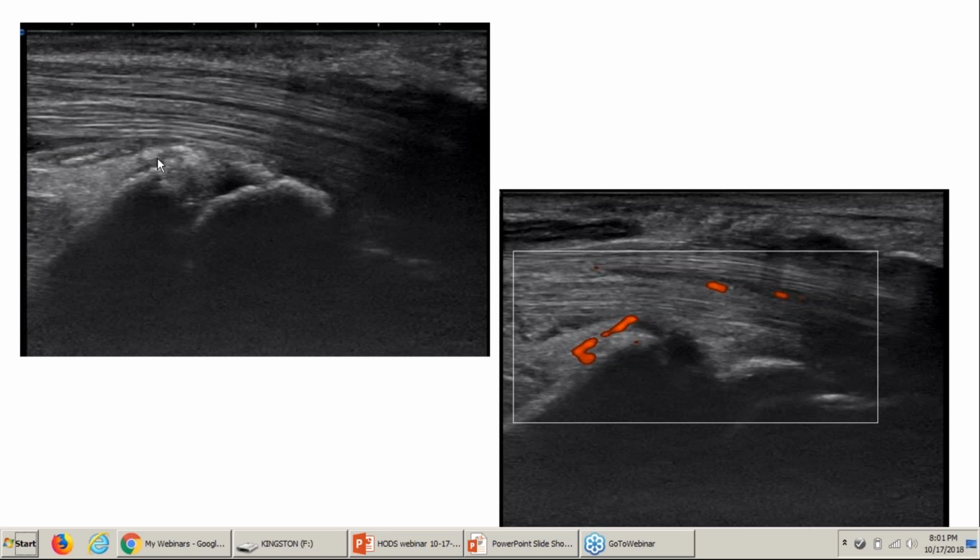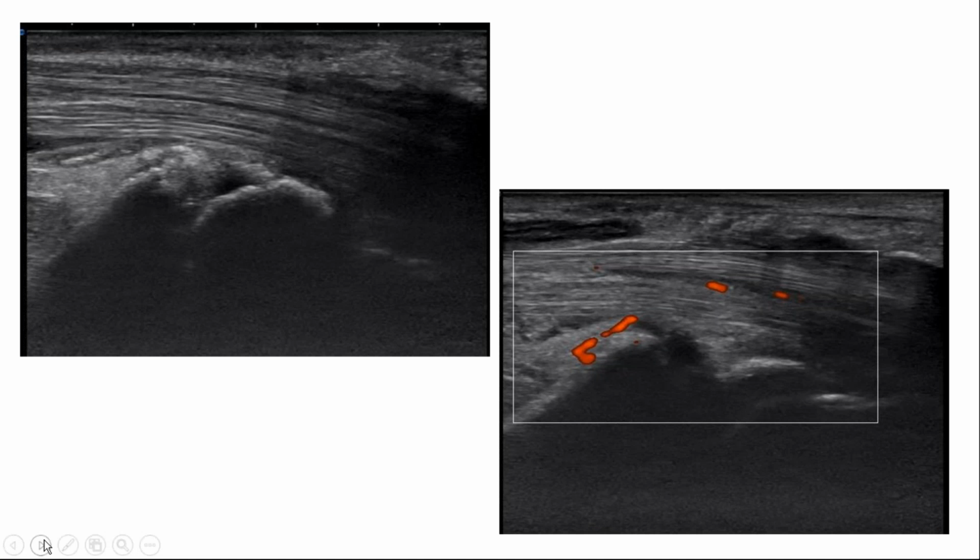Okay, anyway, this is the joint of the same patient. So there is definitely some type of inflammatory arthritis, and also some type of inflammatory soft tissue disorder going on. This patient needs to see an endocrinologist or rheumatologist, someone like that, before jumping on to any non-conservative carpal tunnel treatment. So how would you write this one? Give it a try. Impression.